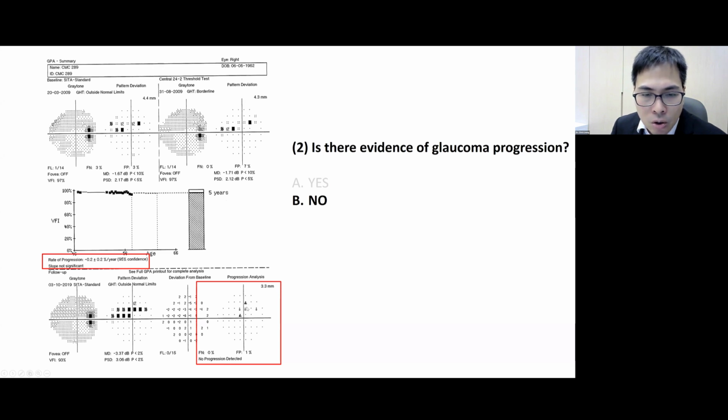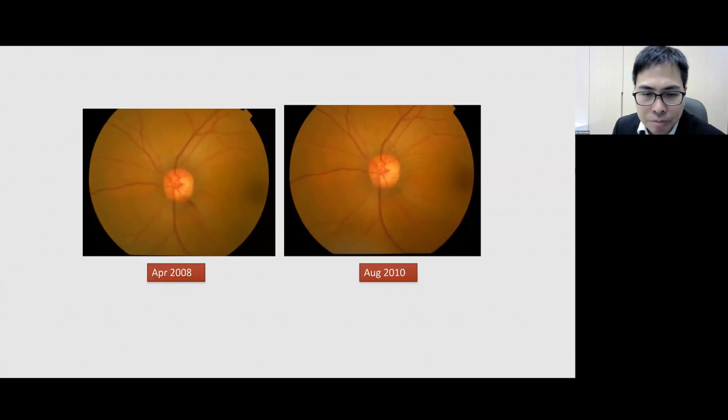There are only 2 half-fill triangles, not fulfilling the criteria of visual field loss. Next time, when the patient comes back for follow-up, the patient may well be having a higher VFI, may well be having a better visual field sensitivity, and the apparent increase in these abnormal points in the pattern deviation plot may be gone, or because of retest variability.